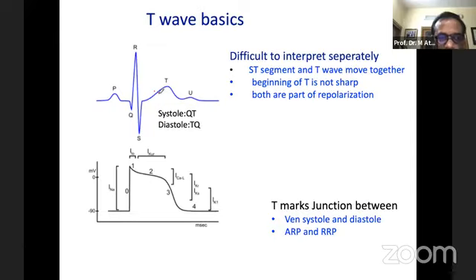And both are part of the repolarization. Both the ST segment and T waves are part of the repolarization of the cardiac action potential. So this is the reason it is difficult to interpret or comment about the T waves separately.